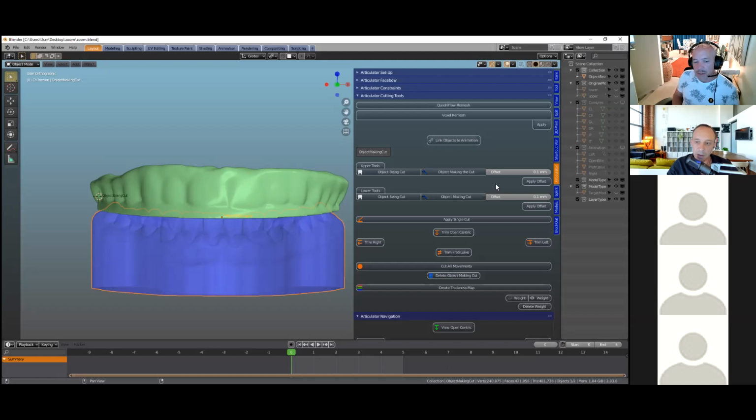Just change it from 0.1 to say 0.15, and then the Boolean should work. Yeah, that's right. But when you do Control Z, don't hit it like in Microsoft Word, going crazy on the keyboard, because all of a sudden you're going to be looking and you don't have a splint left because you're way back in the beginning. So just do it slowly. The code needs some time to run through each backwards operation. Yeah, okay, I got you.